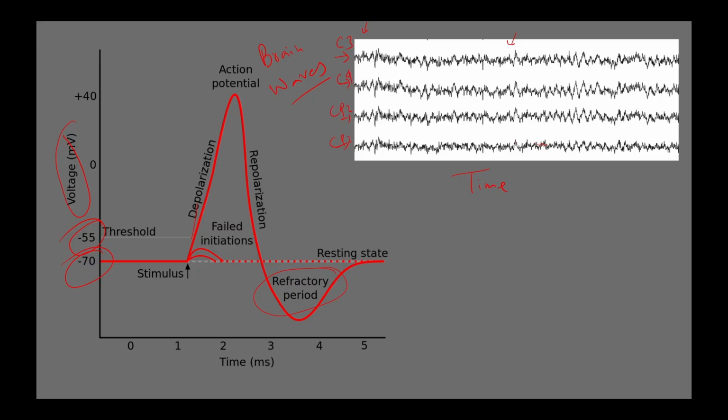Next, what does it mean? How do we get information from this EEG data? It looks messy, like just some oscillations with noise and all those things. And actually, to analyze any information, in the initial stages we broadly divide it into frequency bands.